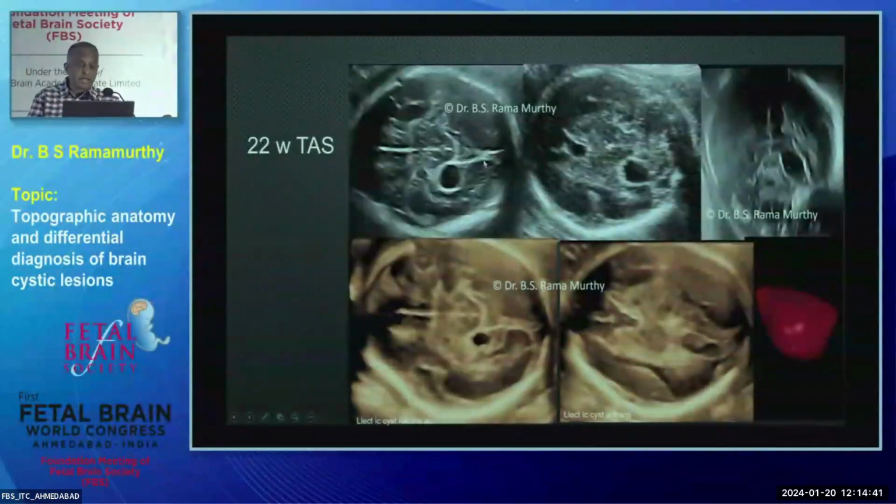Ambient cistern, absolutely. So you have the quadrigeminal cistern here, you have the ambient cisterns going on either side of the brainstem, and a little cephalad, you find the interpeduncular and the suprasellar cisterns. So these are a ring of cisterns around the brainstem, and this is sitting in the ambient cistern, and therefore it is intimately associated with the parahippocampal gyrus and the hippocampus.